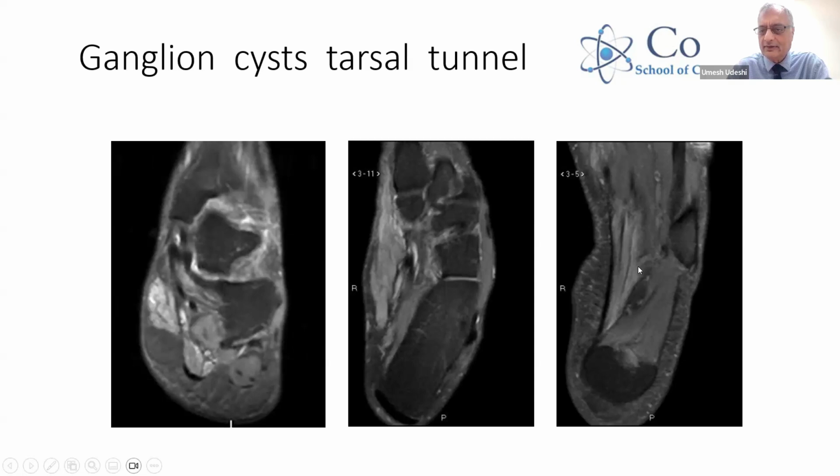And there it is on a more inferior slice compared to this normal muscle here. So that's muscle denervation because it's being pinched by the cysts. And in acute denervation, you can get edema in the muscle. So this is denervation edema, and it's telling us, if we go back to our anatomy books, exactly which nerve is involved and where.